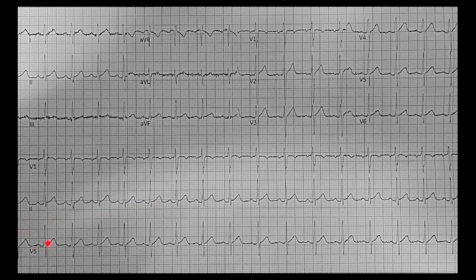And the rhythm strip is the easiest place to do it, but you could do it on any of them. But anyway, I like this one. 1, 2, 3, 4, 5, 6, 7, 8, 9, 10, 11, 12, 13, 14, 15, 16, and just a little bit more, but right around 16. So 16 times 6 gives us, mental math, 96, thereabouts. Let's see if we're close. Yeah, that's what the computer tells us as well.